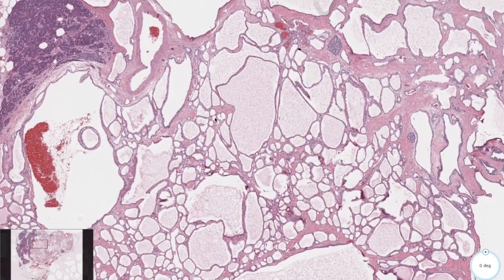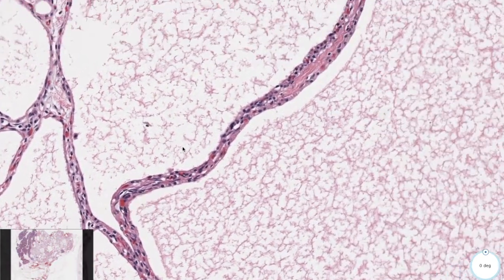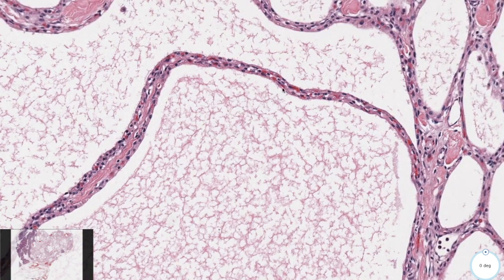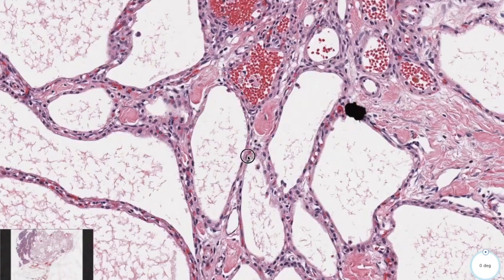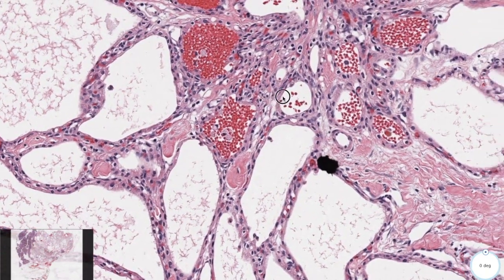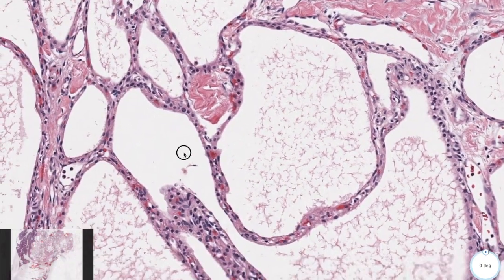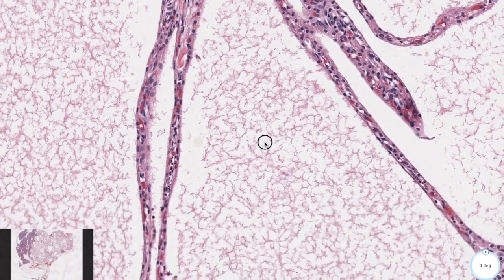So let's take a closer zoom around over here and see what kind of cells we have. What we're seeing so far are these papillary, vascular structures, some microvascular, maybe some capillaries running through these cores. Yep, some capillaries, blood vessel structures. But generally, remember how we saw high-grade dysplastic nuclei in an IPMN in the case before.